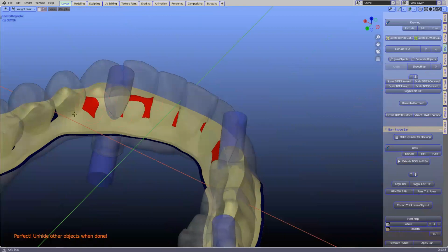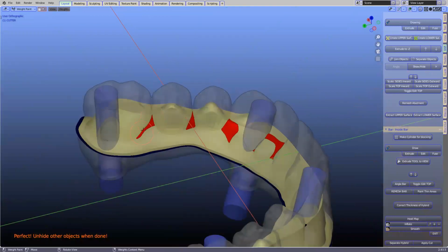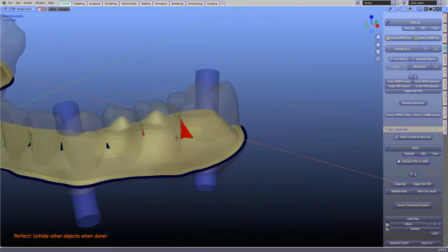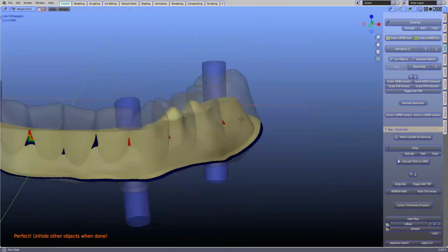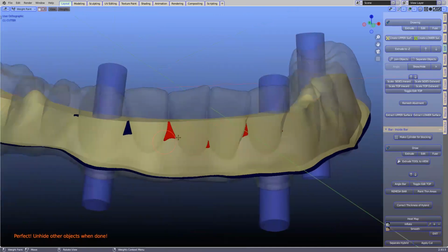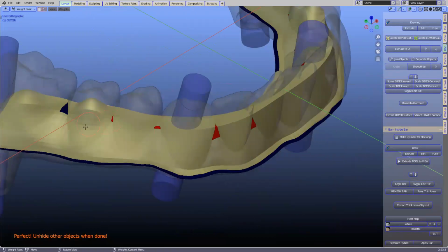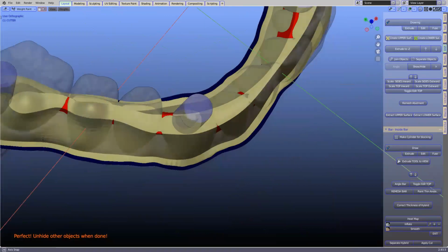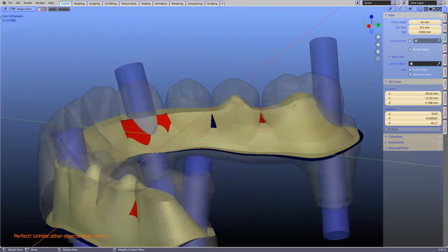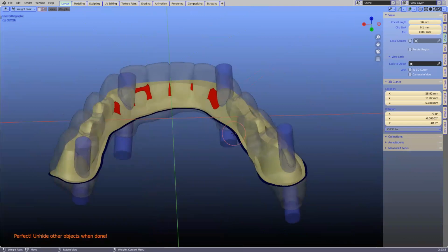Essentially that's just adding a layer onto the denture to thicken it in those areas. Well, can you set the thickness, or is that a preset? It's preset. I think I've got it to 0.7, which is probably quite okay, good for milling, I think. So, of course, we may have users saying they want their own settings or something. I don't know. Okay, so here we go.